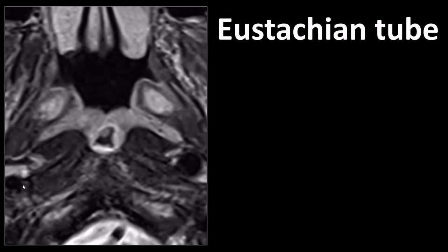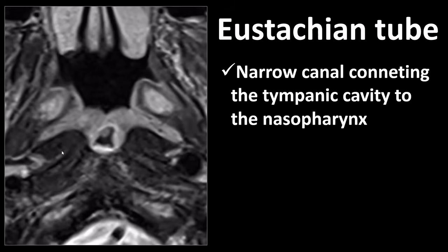On MRI, we can't really see the lumen of the cartilaginous Eustachian tube. What we often see are these very hyperintense components in the Torus Tubarius, and I believe that these correspond to the cartilage lining the Eustachian tube, but I'm not sure because I didn't find a convincing study linking the MRI appearance with pathology.